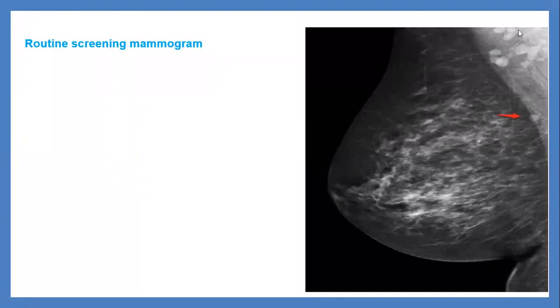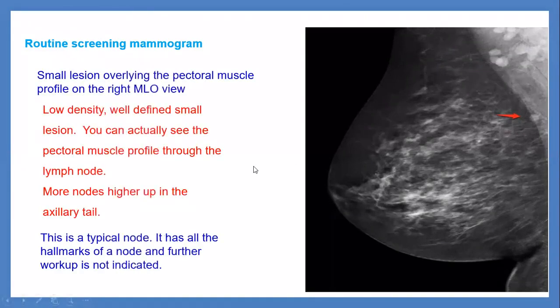Does it look similar to this? It could be a lymph node, yes. Can you see? Could be an intramammary lymph node. But who is talking? Abir? Yes. By locations, this, yes. Intramammary lymph node number 1. Also the lymph node.